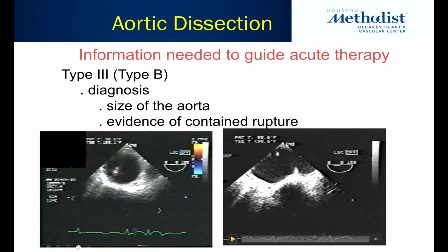All right, well, this is a perforation of the false lumen. Here's the true lumen. This is all false lumen, perforation, and this is now a pseudoaneurysm. So this is basically a rupture of the dissection of the false lumen. Patients survive by creating a false aneurysm instead of bleeding to death. Those can be seen by CT, CMR, and of course by TEE, if you're fortunate enough to be involved in a case like that.